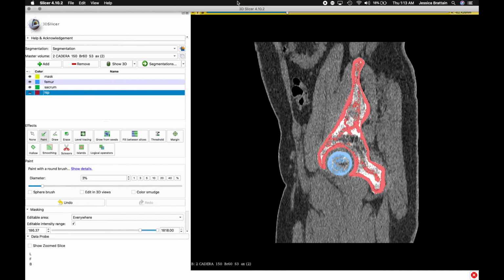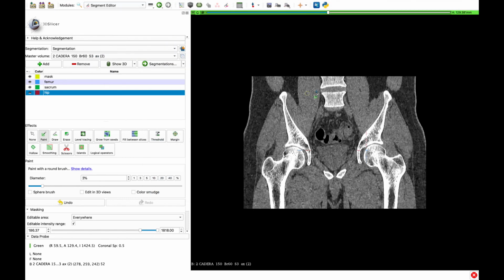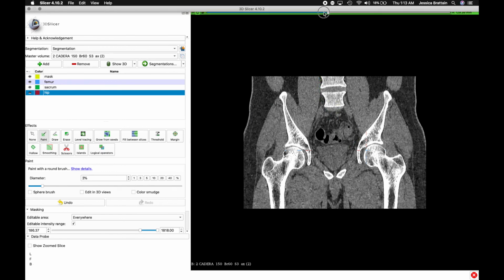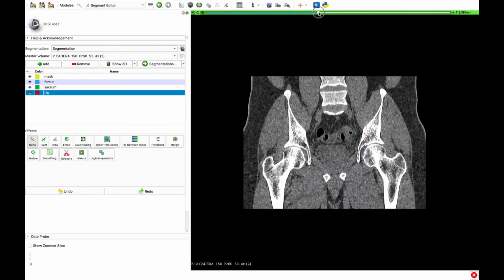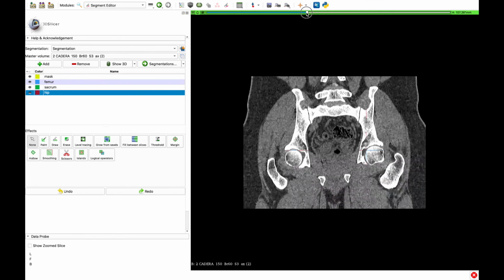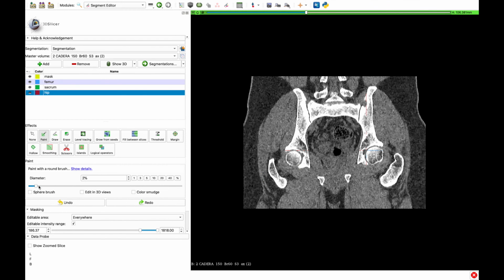All right, we're back in normal time now. We're going to change views and go to our last section, which is the green section. Now we are in the green segment, and we're going to adjust the view. Alrighty, this one's pretty good, but we want to get a better view of that sacrum bone. I'm going to do what I did in the previous section and flash forward through time. All we're doing here is what we've been doing, painting the segments their correlating colors.